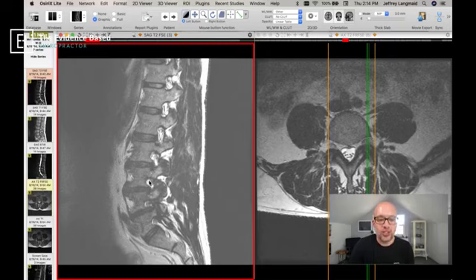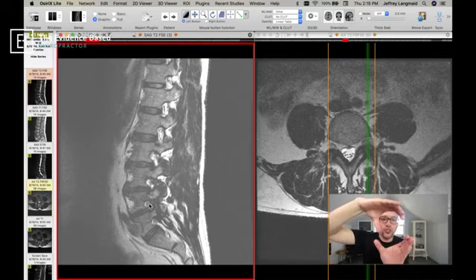And now we go down to our trouble level. Look at that. There is just absolutely no space for that nerve to go out. That's actually the nerve right there coming out at us. So there's a very limited amount of room where the nerve wants to travel out. And why is that? Well, half of the hole where the nerve travels out is the top bone. Half the hole is the bottom bone.